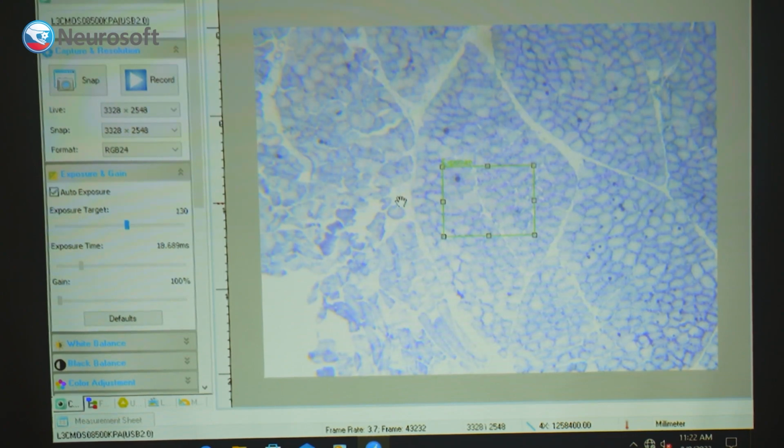Yeah, so unfortunately this is inconclusive. You need more, at least ATPase, and maybe P62 would be helpful, but in this case you didn't perform immunohistochemistry against P62. One possibility, as the doctor mentioned, is a myofibrillar myopathy or GNE myopathy.